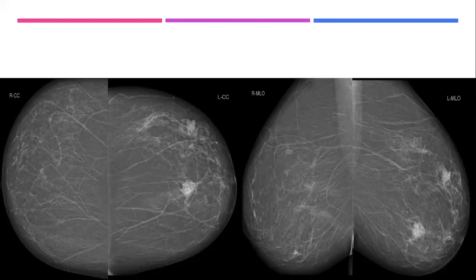How could we characterize these lesions, to classify it as BI-RADS? Quickly, BI-RADS? BI-RADS 4C for me. Excellent, BI-RADS 4C. Why BI-RADS 4C? Tell me in one word why. Spiculation. If it is spiculated, it will be 5. But we are not sure if there is spiculation or not. But we are sure these are irregular in shape. Indistinct.